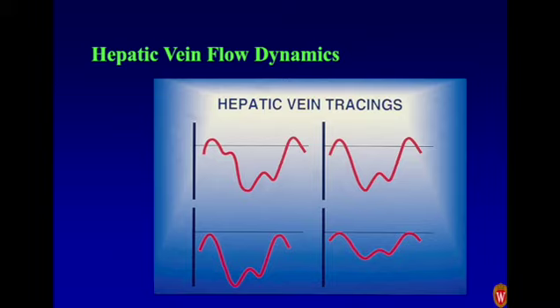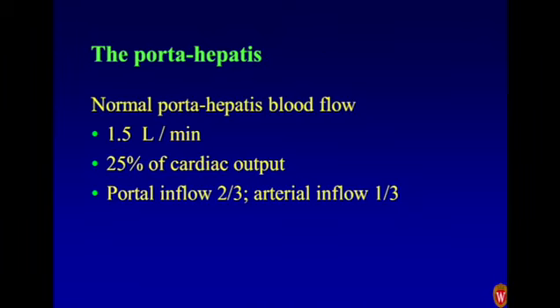It can't because there is no medium across which to transmit that flow. You need fluid. So, if you go further away from the heart, typically it's going to be a flattened waveform. But don't be surprised if you see that waveform down in the femoral veins of a patient who is vigorously hydrated. All right. So let's go to the other side of the liver, the porta hepatis.